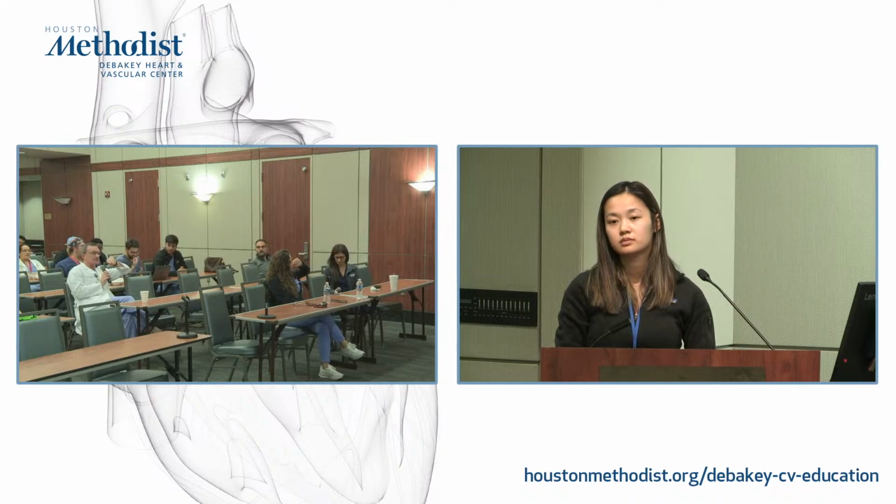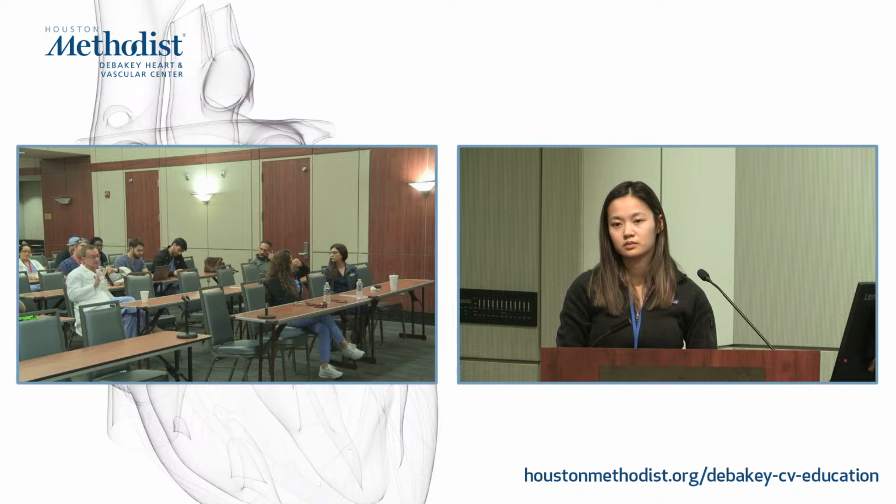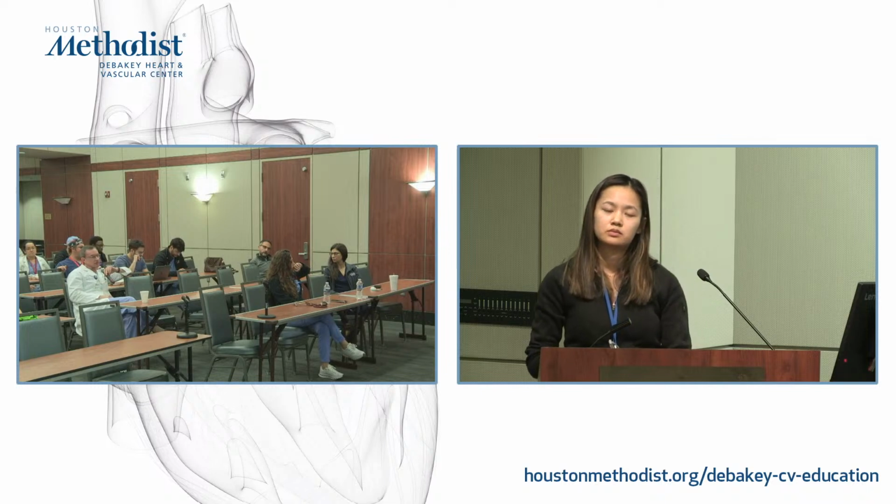So I'll just comment on the two cases. You showed a lot of 3D. Zoom 3D is the format, showing from the left atrium down, and obviously that is how we do a lot of these cases. There's variety across the country. Nobody uses 2D exclusively. Some people use a lot more X-plane without a lot of 3D. Some places use MPR a lot, more than we do. There's no right or wrong answer. It's just whatever you're comfortable with and your ICs are comfortable with and people understand in the room. So we've evolved this very 3D-focused version of these cases, but there's variety around the country.